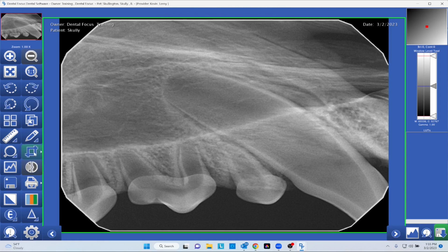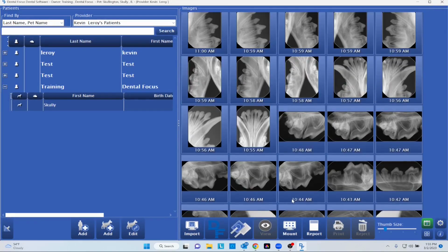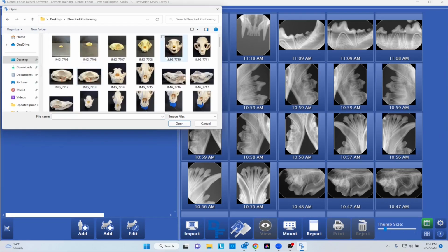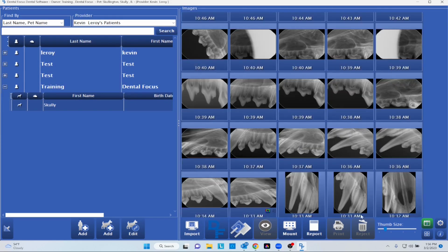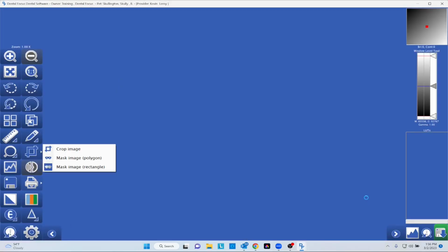Close that. Cropping the image. This is usually better for when we have an uploaded photograph. And in this case, we can show you how to import. Let's come and import an image. In this case, we'll take a photograph from today, and we can bring him in.